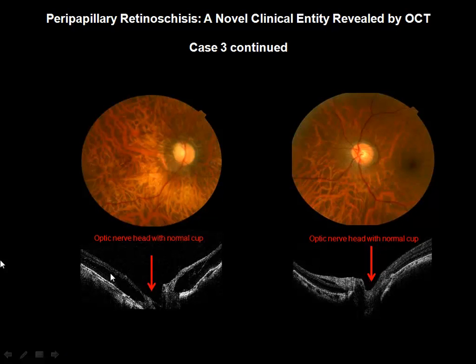Here's a slice right through the optic nerve head. This is temporal in the right eye and nasal in the right eye. You can see both splits. In the eye that still sees, the split occurs nasally over here, but there's no split temporally. So whenever you get to see these high myopes, I think you should image the disc and the macula.